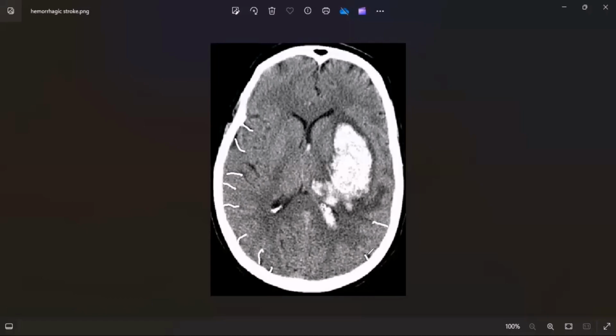Look at this one. Look at this one. Do you see that? Yes, Doc. All the dark ones. So if you give the patient a contrast, the contrast medium will fill these spaces. So that's how to tell a contrast head CT from a plain head CT. Are you with me? Yes, I'll show you a picture soon, but I'm just telling you how it will look like.